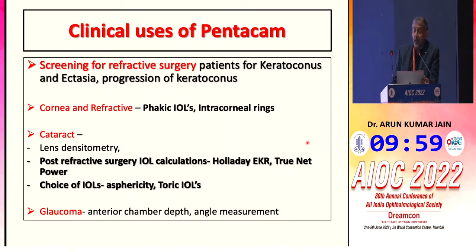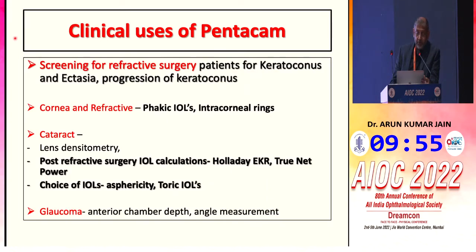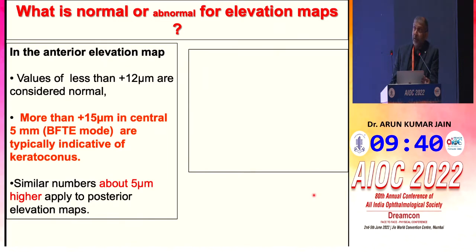So there are a lot of applications, even in glaucoma. So I will be restricting myself only to these three: screening for refractive surgery, post-refractive IOL calculation, and choice of aspheric IOL. So coming to the first topic of keratoconus screening. There are various maps on this Pentacam.